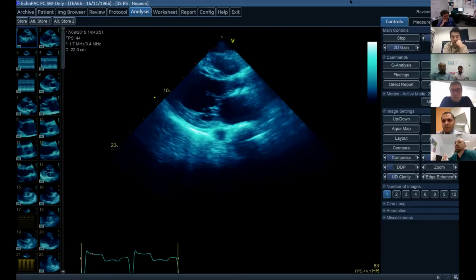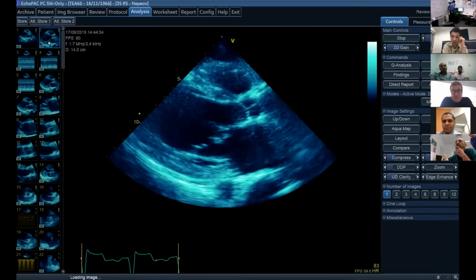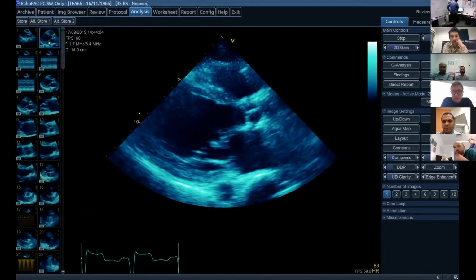So, do you want me to just? Yeah, I mean, do you want to maybe pull up an image or two? Does anyone want to have a go? Are they coming through okay at the other end? Mm-hmm. Yeah, pick on someone and get them to report it, just so we can practice our banter. Okay. Who's first?